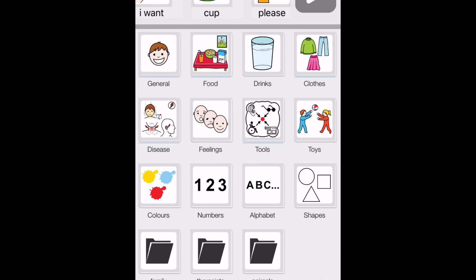So this is one of my absolutely all-time favorite tools as a pediatric physical therapist. I think it's amazing. I think it's so much more versatile, honestly, than a lot of the augmentative communication devices, because it's so adaptable, and every family member could have the same folders. They could have it all on their cell phone or an iPad. And it's just so much more versatile than having one device that you need someone else to program.